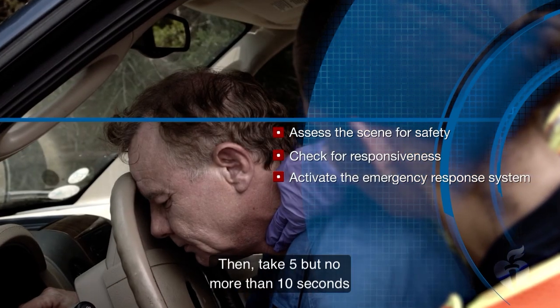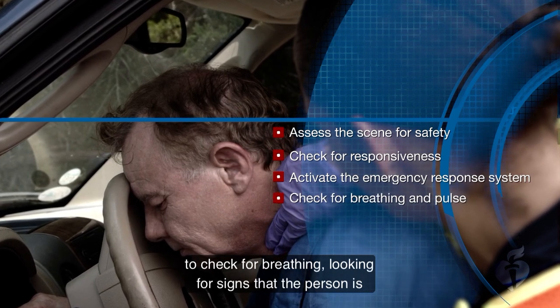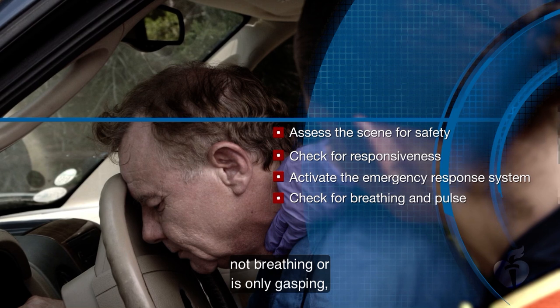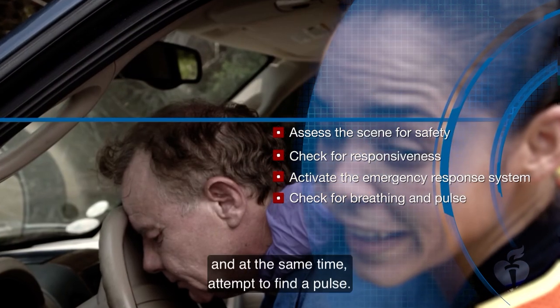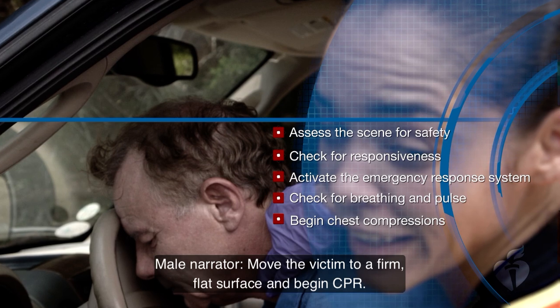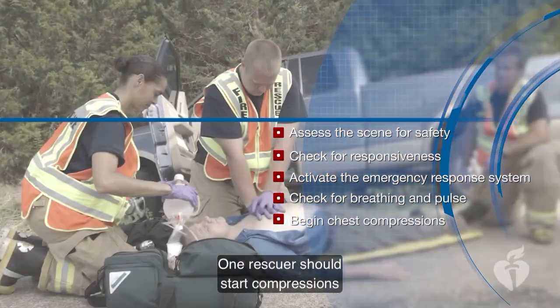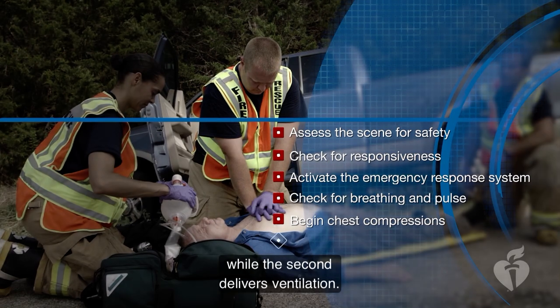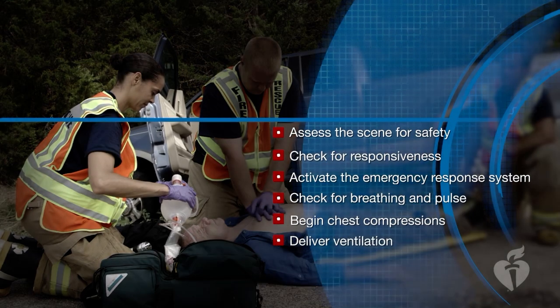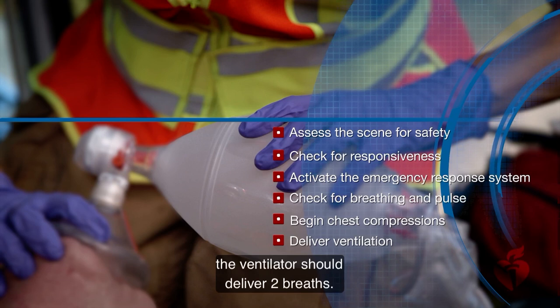Then take 5, but no more than 10 seconds to check for breathing, looking for signs that the person is not breathing or is only gasping, and at the same time, attempt to find a pulse. Move the victim to a firm, flat surface and begin CPR. One rescuer should start compressions while the second delivers ventilation. After each set of 30 compressions, the ventilator should deliver 2 breaths.